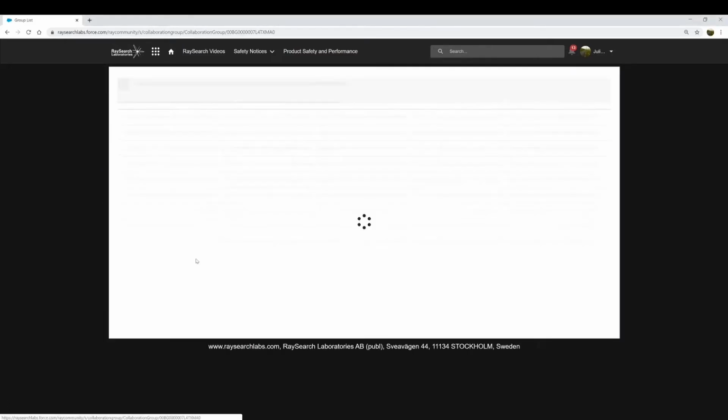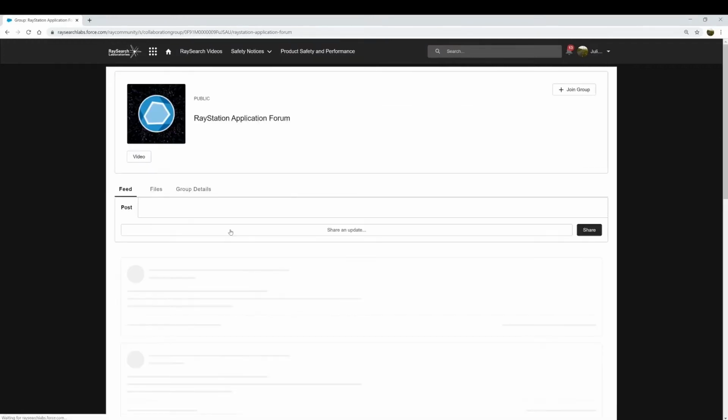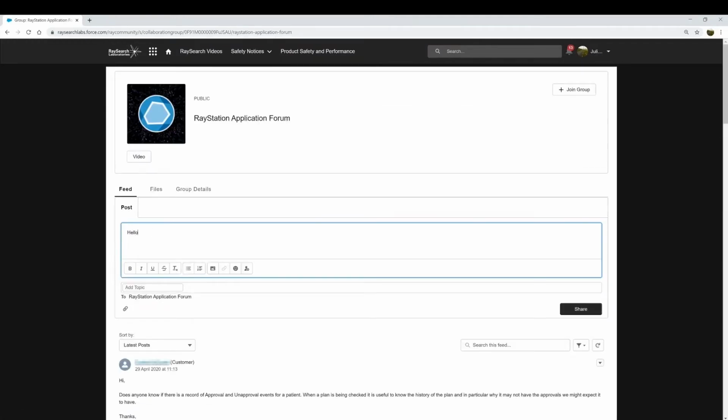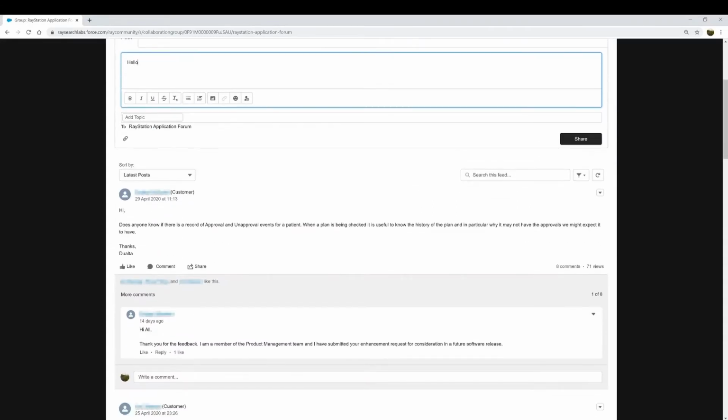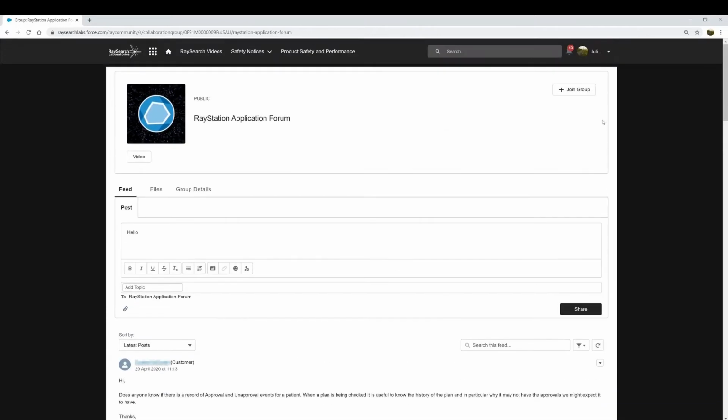You can browse and join RaySearch product user groups. These groups focus on a topic or a specific geographic region. To initiate a new conversation, simply post a message. You can also contribute to an ongoing discussion by replying in the thread. If you want to be notified by email about conversations taking place in a particular group, consider joining with this button. RaySearch support staff also contribute to the discussions.